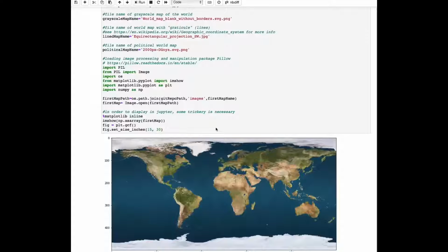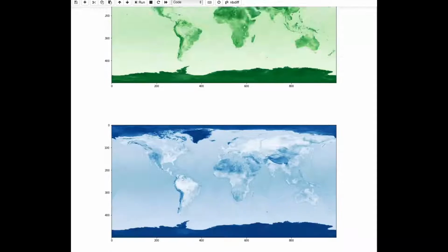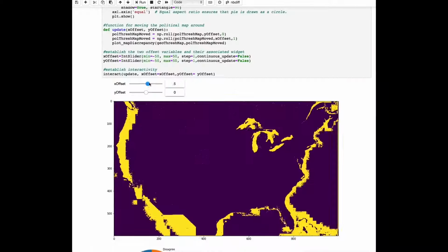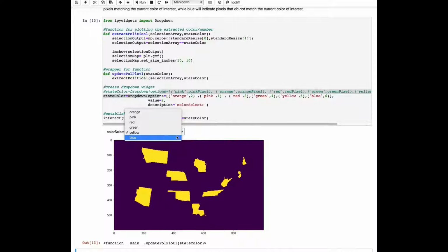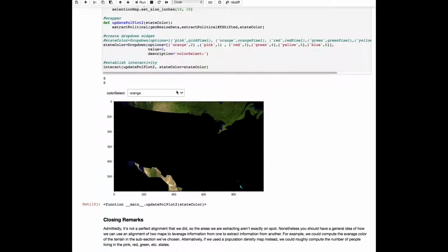Instead, WMSE actually begins with a consideration of two-dimensional digital images, like JPEGs. It uses these as examples of digital data objects, and shows, interactively, how the data in these can be used to perform operations like image alignment, masking, and region of interest selection or extraction. These operations, of course, are fundamental tools when performing an anatomically informed tractography segmentation.